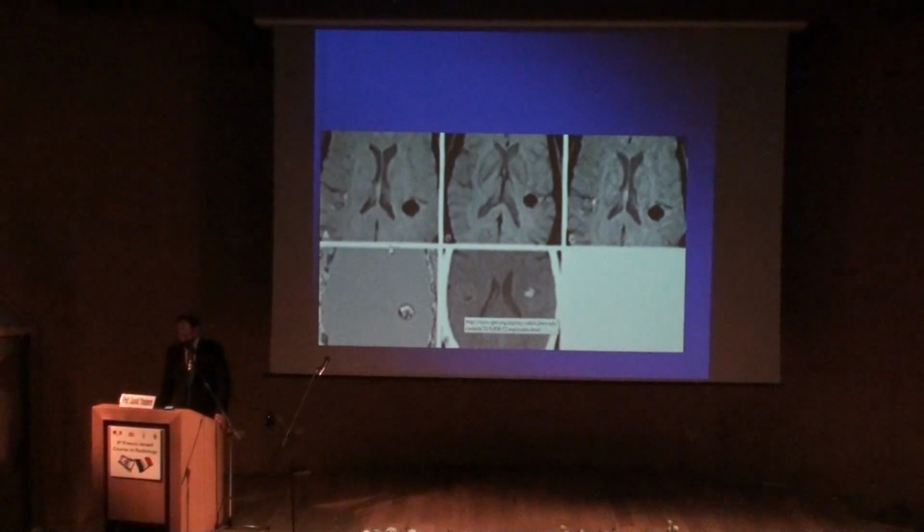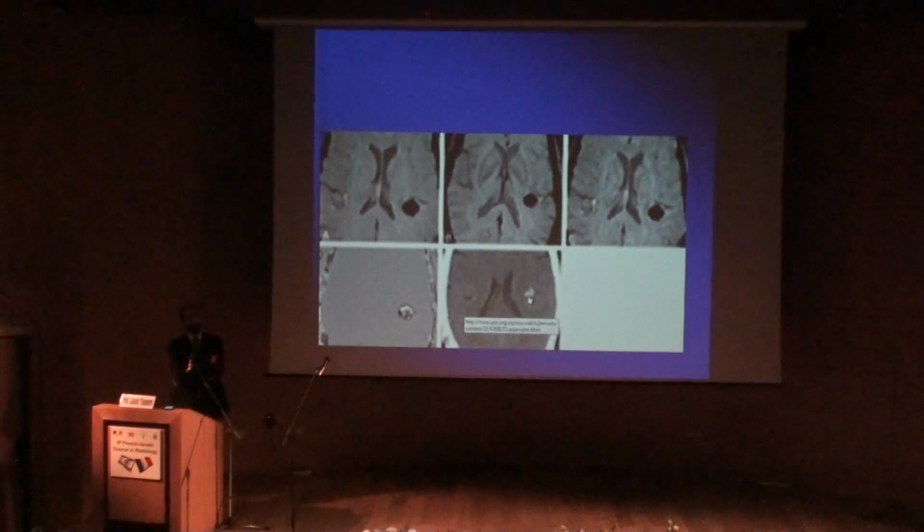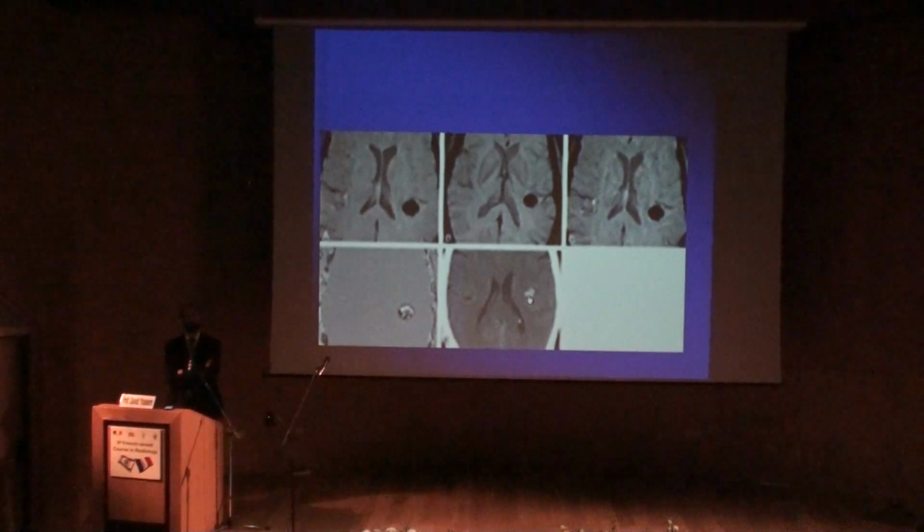Another example that you see, this one showing the dark signal intensity in the SWI and the phase on the phase image, and then the calcification on the CT. So we wrote this paper, and we got a letter to the editor by one of Dr. Haacke's students saying that what Yousem et al. wrote is only true if they have a right-handed scanner as opposed to a left-handed scanner.